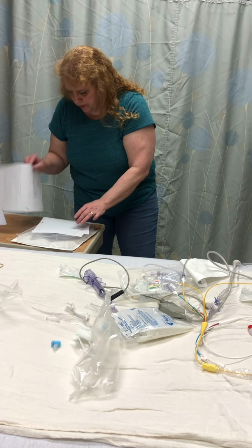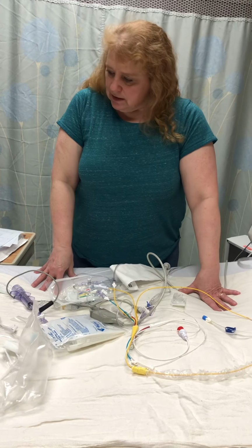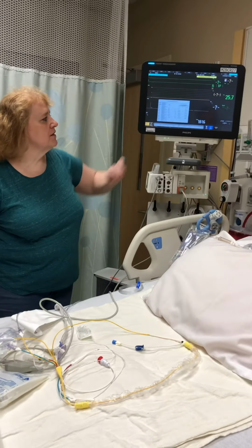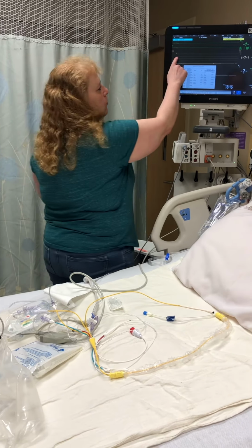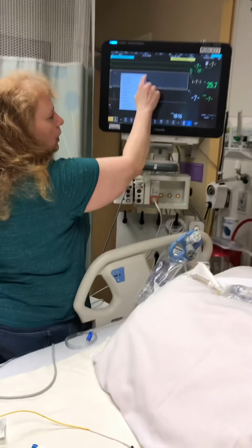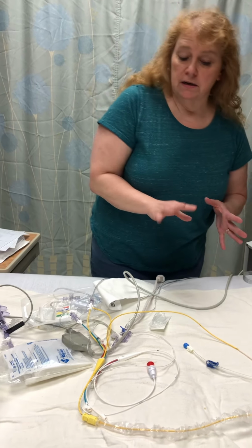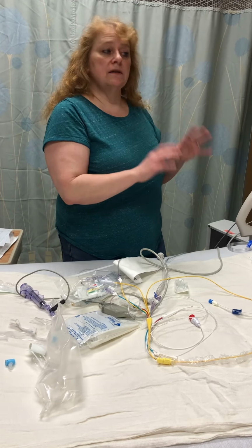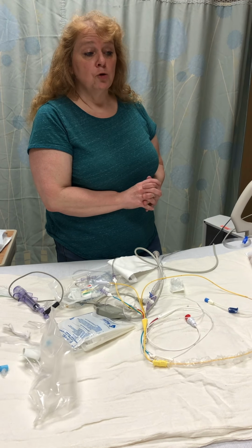Let's see, a couple other things. In a perfect world when we're measuring, I do just have to mention this, if the patient has a lot of respiratory variation on the monitor, you see your waveforms are here and then all of a sudden down here. If they have a lot of respiratory variation, the ideal place to check would be at end expiration. And there's a couple of ways to do this. Our monitors now are pretty good. They're able to get us a pretty accurate number, and honestly, I have not had to do the end expiration thing in quite a while.